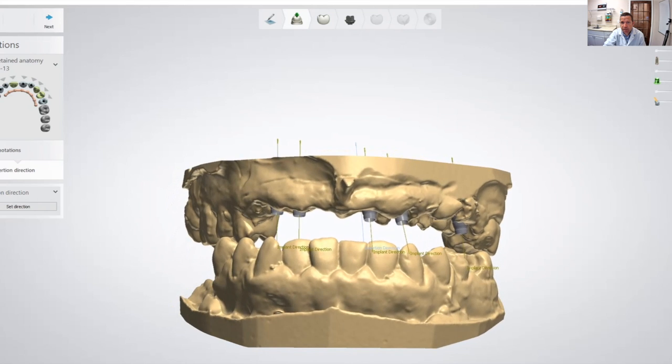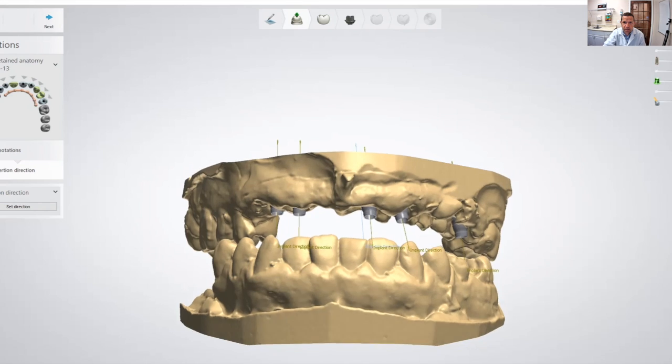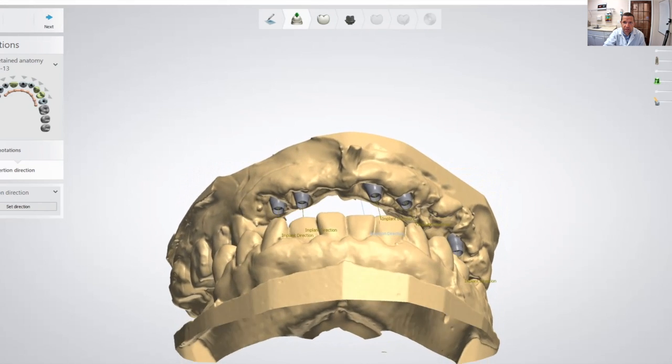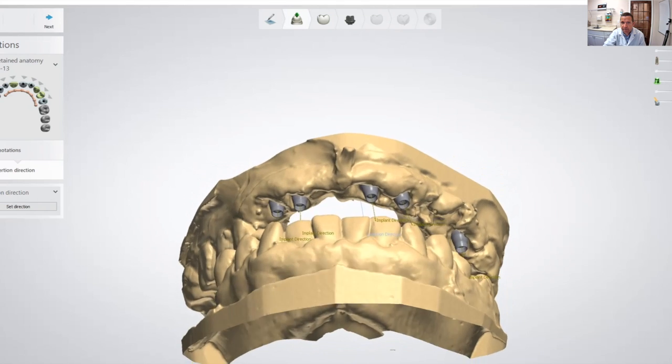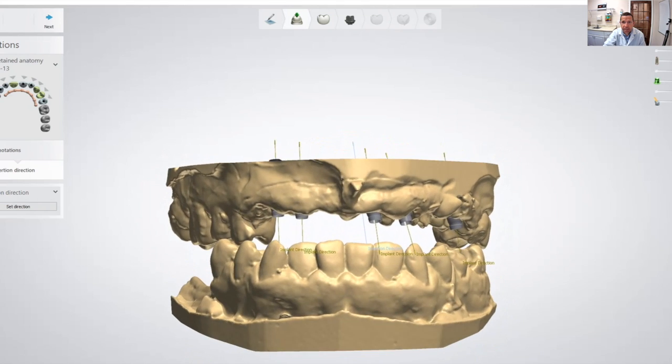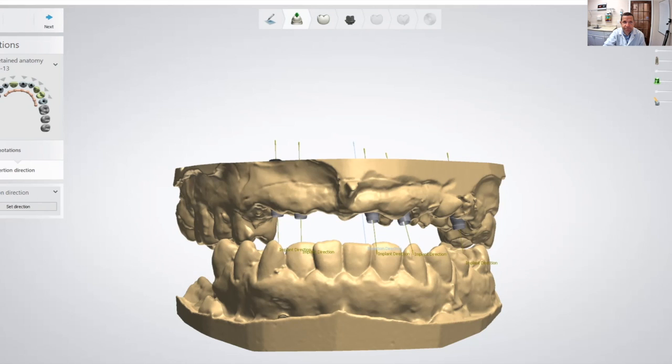If he's going to have a lot of shrinkage, I'm simply going to leave this as permanent. If he doesn't have a lot of shrinkage of the soft tissue, I'm going to add porcelain later on after he's healed. So I already scanned it, I have the bite, I have the two models. So let's proceed with the design.